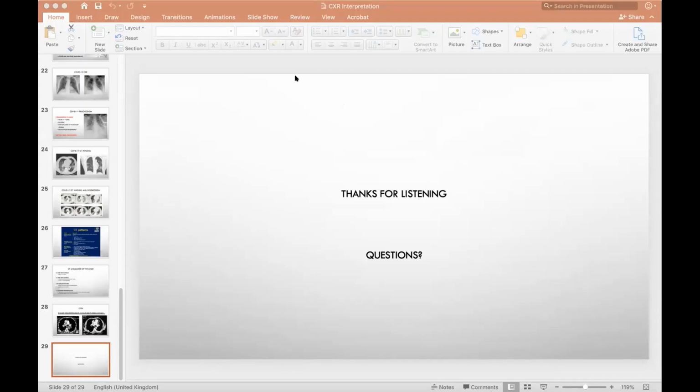Yeah, so obviously, aside from clinically, so if they're in pain, then obviously it's a fresh rib fracture, but your fresh rib fractures will show a break in the border of the rib. Old rib fractures will look more like an oval callus shape around where the old fracture was. So you'll see that it's a smooth border, but it's smoothly protruding out because callus is formed around it.